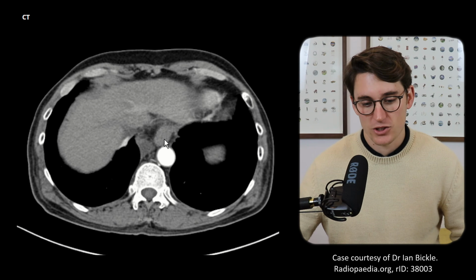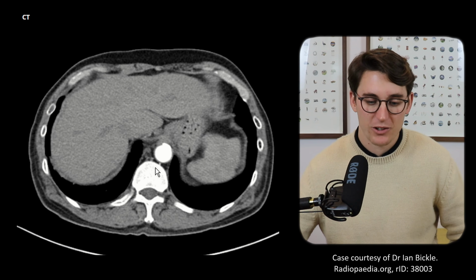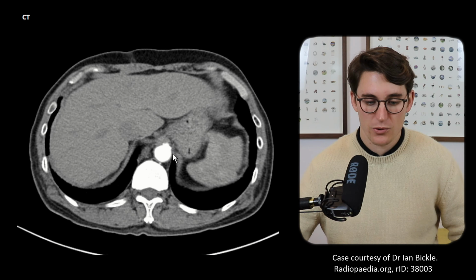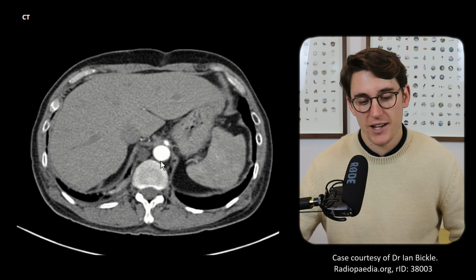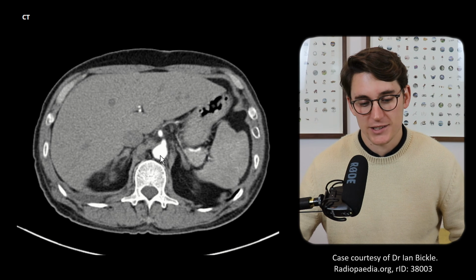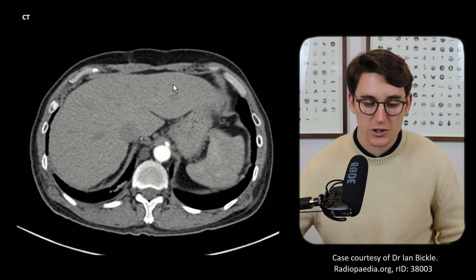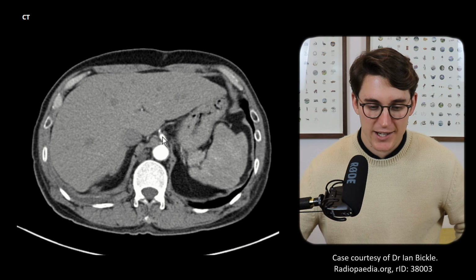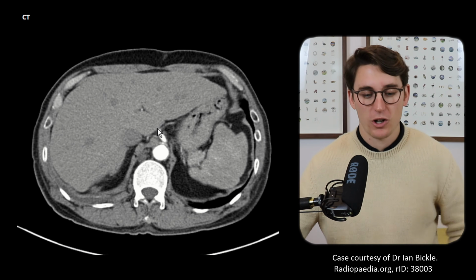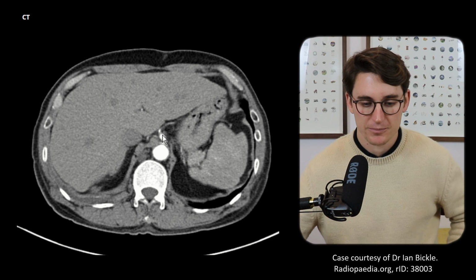We see that esophagus diving down into the abdomen there, and then slightly lower down at the level of T12, our abdominal aorta is starting. That's going through the diaphragm here. We can see our azygous vein coming up on the right-hand side, and our abdominal aorta now piercing the diaphragm before giving off those major branches. So you can see our first branch here, which is going to be our celiac trunk that we've just covered. It heads anteriorly before giving off that first branch, that left gastric artery supplying that lesser curvature of the stomach.